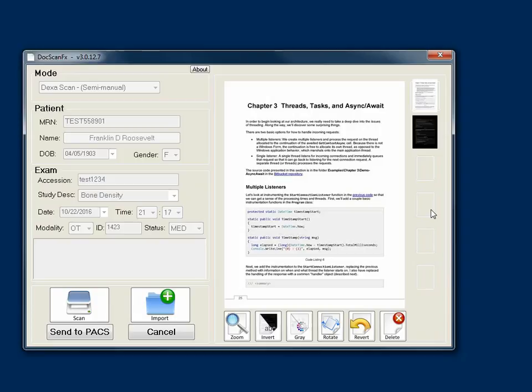So whether we're querying different PACS archives or modality work lists, users just simply choose a mode and are presented with only the options and tools that are relevant to the information that they're adding. This ensures consistency with your documentation because each mode can flag images with mode-specific series descriptions, meaningful series numbers, and more. And depending on your PACS's capabilities, you can use these consistent descriptors to improve your PACS's workflow too.